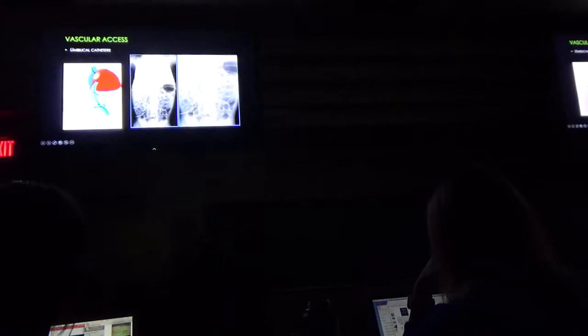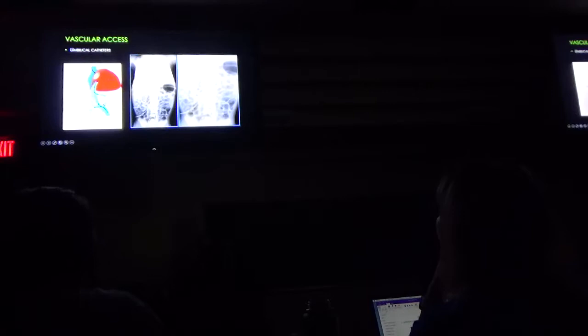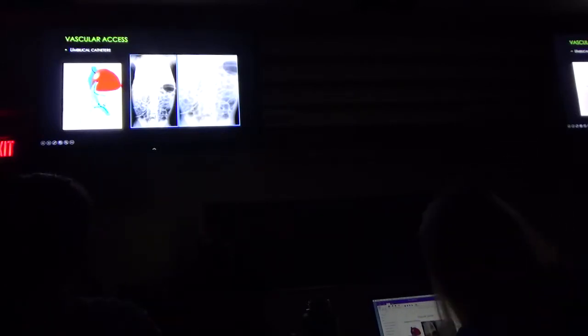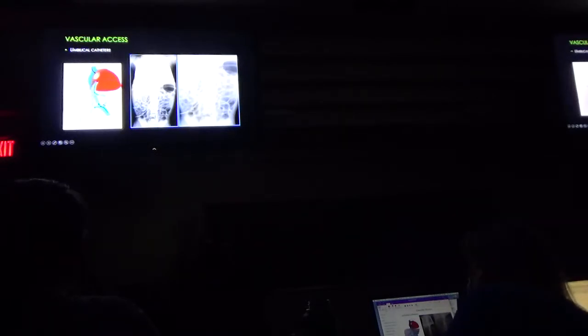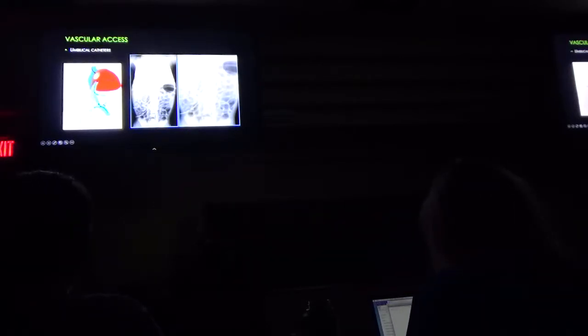This is one that started arterial, and they were feeding it, and it just continued. When it started to go up, it coiled back down and went down. So again, reason for placement: even though you have the length from where you think it should have ended up here, it didn't. It just started to coil upon itself like a rolled up garden hose. So making sure you've got placement where you're going to get good perfusion of those fluids is extremely important. Could be a matter of life or death.